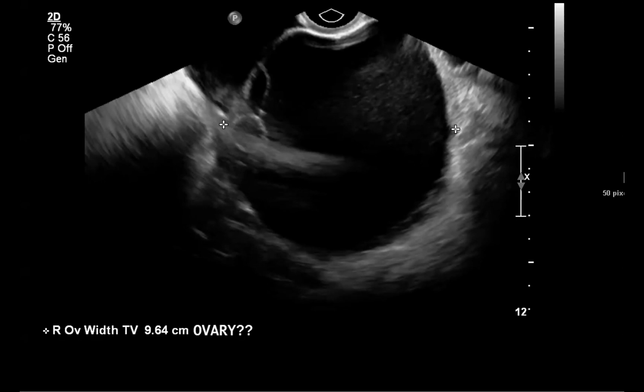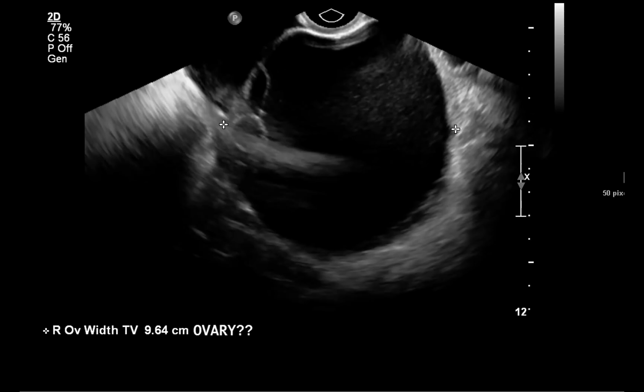Okay. Yeah, I thought about this kind of cyst. Can you hear me? Yes. When you said it was very large, and when I saw those solid components, I thought of a case with a very large one, about 30 centimeters. The whole abdomen was affected in a patient who was actually not young, about 50 or 55.